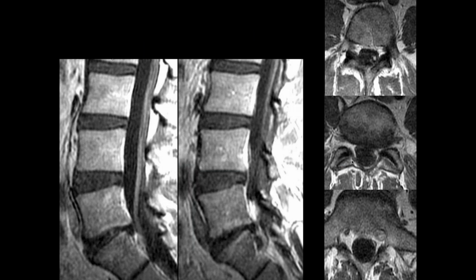So what do you think here? Okay, so at L5-S1 there is some mild retrolisthesis of L5 on S1 and endplate changes and disc protrusion at that level with the loss of height. These are all post-contrast images. Right, some enhancement of the left, what do you call the nerve root over there. So we can see that this is a bright nerve root coming all the way down here. And there we can see it there, here, enhancing and it's thickened in this location.